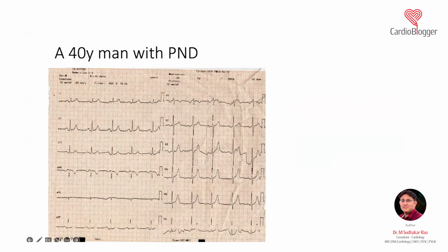So these are the few things to differentiate a right atrial enlargement from a left atrial enlargement. Again, how to differentiate right atrial and ventricular hypertrophy from left atrial and ventricular hypertrophy. If you want to differentiate an atrial from a ventricular hypertrophy, in the left it is very easy. I am just coming to the ventricular hypertrophy of the left. Left ventricular hypertrophy is the easiest to differentiate among the four, because it has a very high QRS voltage criteria. The QRS voltage will be very high.